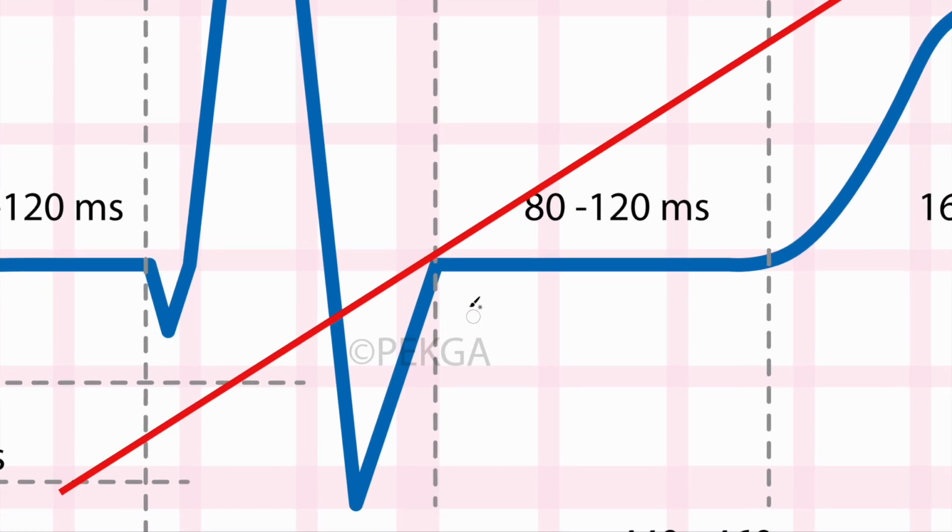What you're looking for is the point where, if you were to draw this line, and I'll show you what I mean by draw that line in just a moment, the angle after your J point or your inflection point and the angle before it, of this line compared to your QRS or whatever EKG data you're pulling off of it, they're equal. So this angle is equal to this angle over here. That's your inflection point and that's your J point.